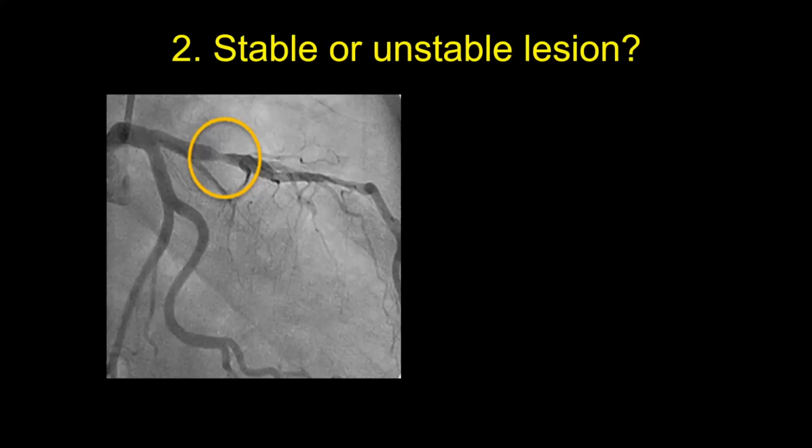Same question. Shazia, you cannot. No, Yasir, you wait. It's for Shazia. I'd like to say that I want a clinical history, but based on that appearance alone, I'd probably verge on it being a stable lesion.